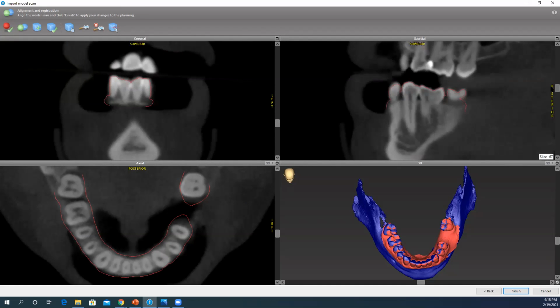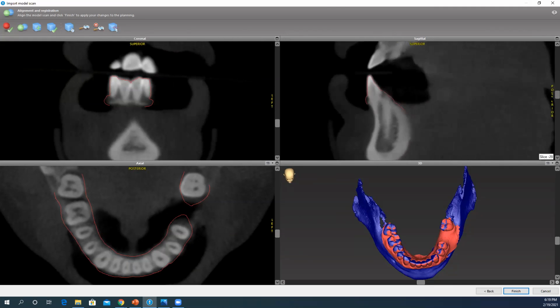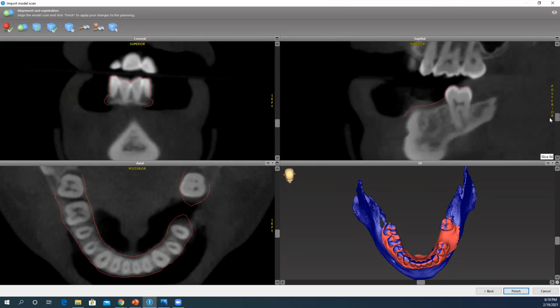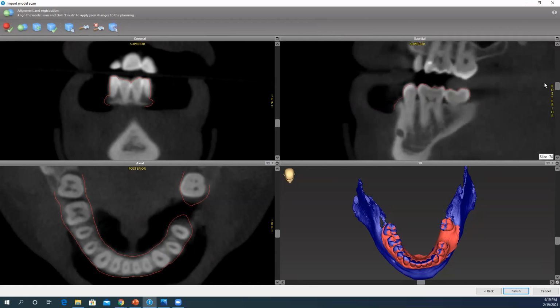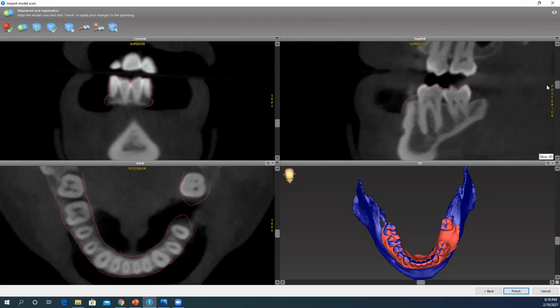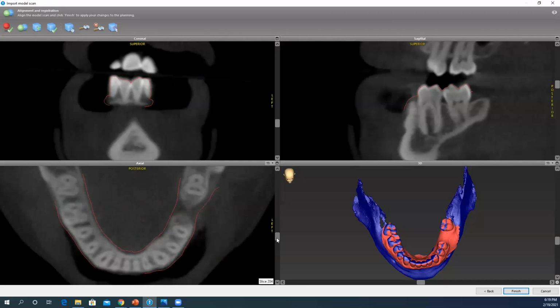So I'm going to quickly scroll through all of these views, making sure that I have a good match. Now, for example, if tooth number 31 was crowned, it could have created an artifact and give you the feeling that it might not be matching.